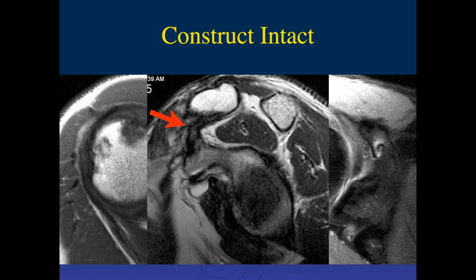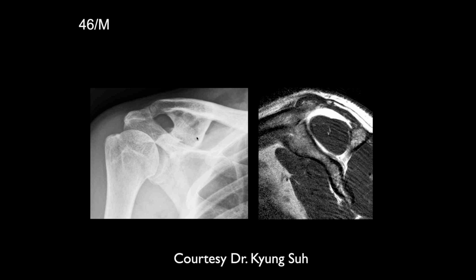Yeah. And that's why it was made by Bosworth for this condition. So I like the screw, but for another condition. It's important to look in multiple planes here because we can see in the sagittal plane that it is intact.